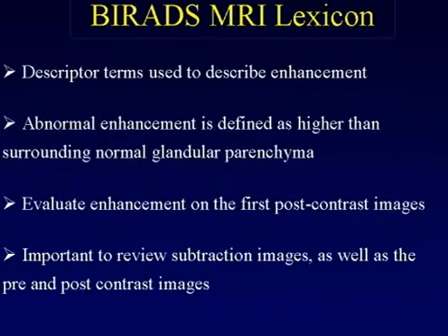So now let's get back to the lexicon. At the end of the day, this is a whole series of descriptor terms which has been used to describe enhancement. So what exactly is enhancement? Well, you're going to be looking for tissue that appears a little bit brighter than the normal glandular tissue.